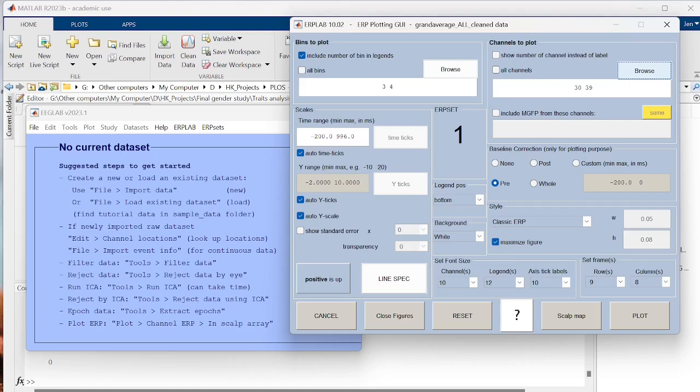So this means that the grand average of the eye electrodes, if they're included initially in the scaling of the y-axis, pushes this to quite extreme thresholds, because you've still got the blinks included, but only in the eye electrodes. So once you deselect the eye electrodes and you select only the electrodes you want, this scale should come back down to a normal range. But if it doesn't, you just need to deselect and reselect, and it should update at that point.